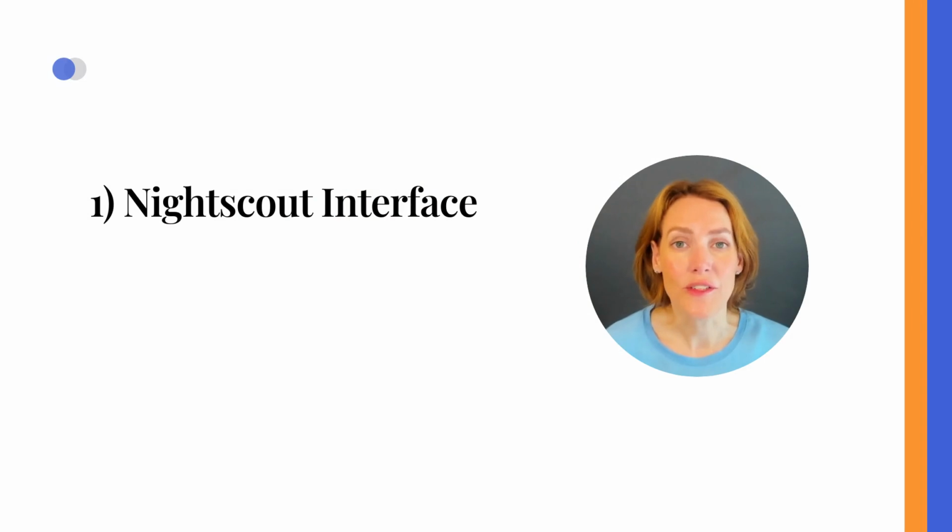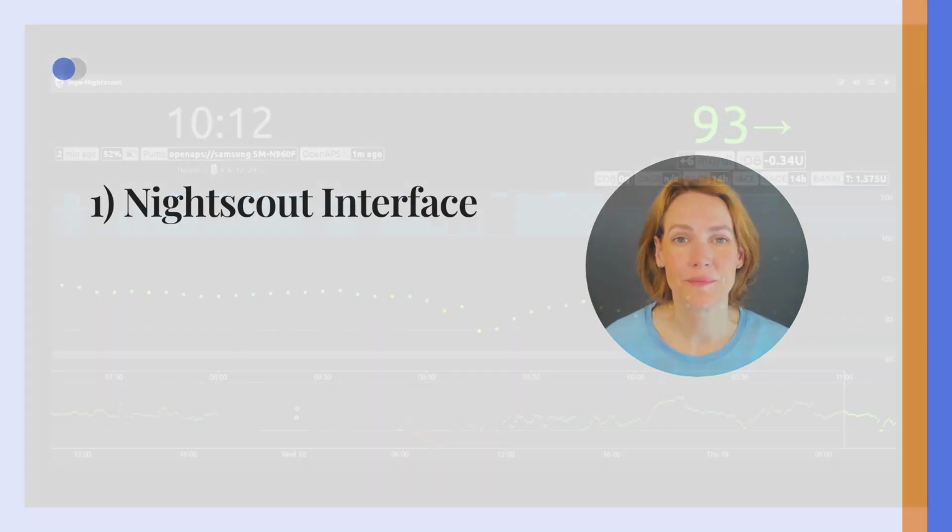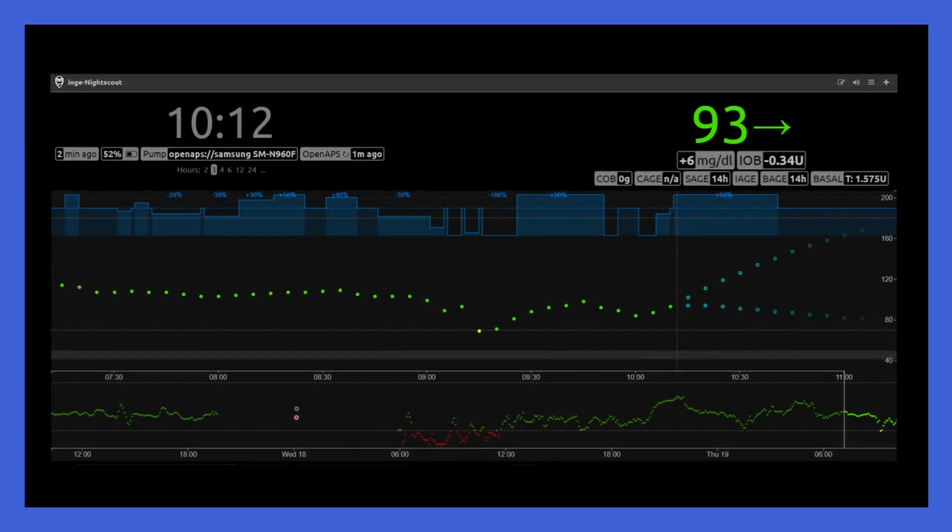1. Nightscout interface. In the Nightscout interface, the website is typically black and can be customized based on your preferences. Here are the different sections of a Nightscout website.